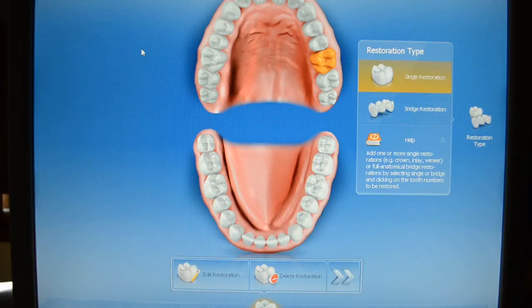First reason to copy is if we are working on a tooth that we love the way it looks already and we've got good occlusion. So a great example of that is we're sectioning off an old crown that has recurrent decay. But the contours are great, the occlusion's great, we're happy with it, we're just going to copy it.